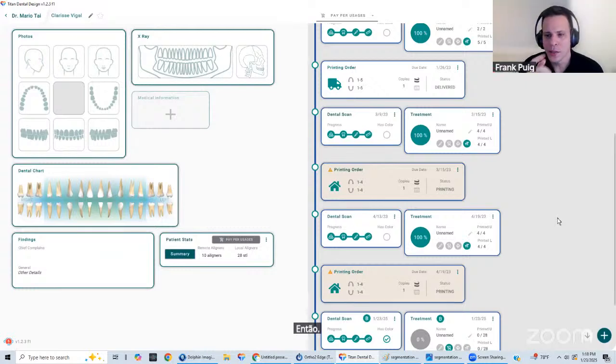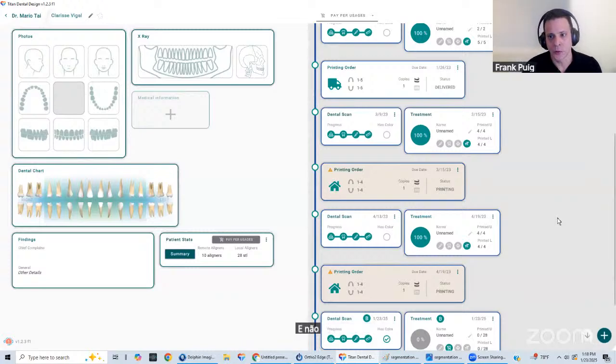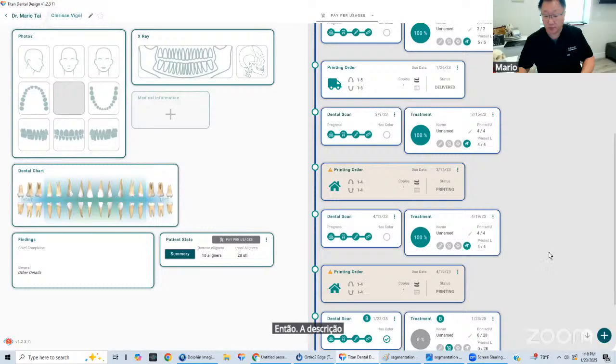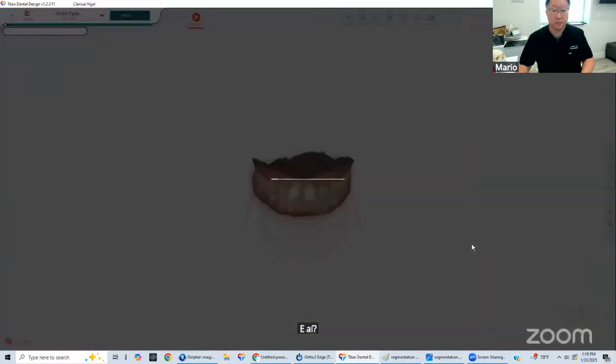No worries. One thing to add on top of that, yes, we do. So attachments, we're very focused on having attachments be useful. And we are about to release a big update on attachments for the AI. So we do have presets. So Ty, if you can go to the attachment section. Sure. Let me open this one. Yeah.